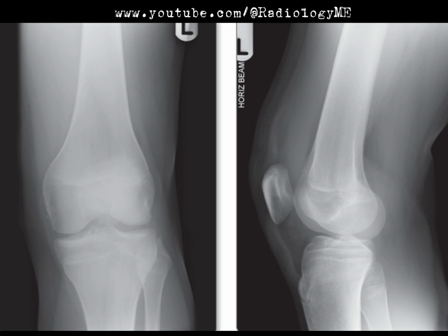Oh, and don't miss the fracture through the medial tibial spine. Though, to be honest, we can't really see the full extent of that one clearly in these images, so we'd want to keep that in mind. Now, what's not there is equally important, right? I don't see any significant flattening of the tibial plateau that would scream major instability, but I wouldn't rule it out just yet. And there's no obvious ligamentous damage that we can see from the bones alone, but we know that with this pattern of injury, soft tissue structures, especially the ligaments, are often involved.